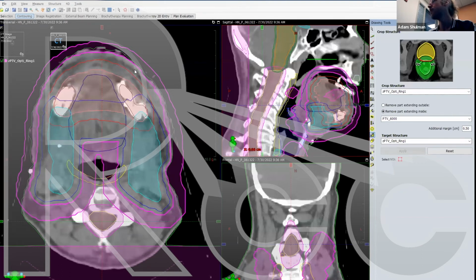It's a little bit further away from 54, according to 5% per millimeter, 3 millimeters away from here, but we limit it at 85% of the 54 prescription dose.